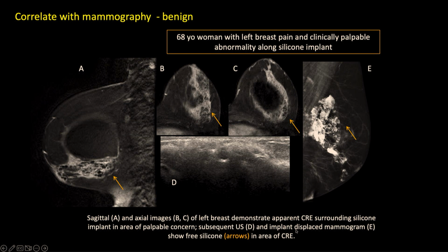It's also important to compare what you have on MRI with mammogram and ultrasound. All our imaging tools are multimodality, and I say that one doesn't exist without the other. So this is a nice case.